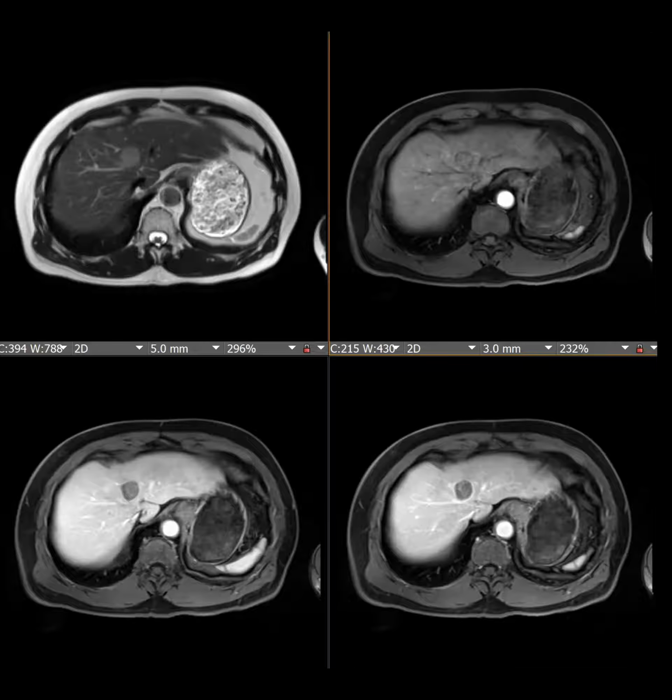So Victoria, I have a question. Very often we don't get any history at all. In that case, how do you read these things out? If there's clearly cirrhosis, then I just read.